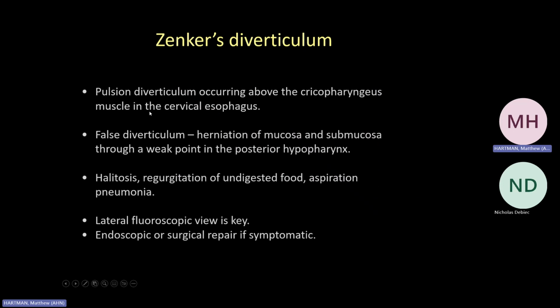This is a pulsion diverticulum, occurs above the cricopharyngeus muscle. It's a false or pseudodiverticulum, not all of the layers, but can present with halitosis, regurgitation of undigested food. And the lateral view is key for making this diagnosis.